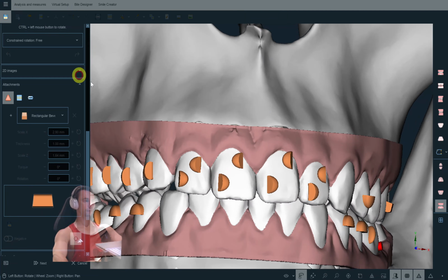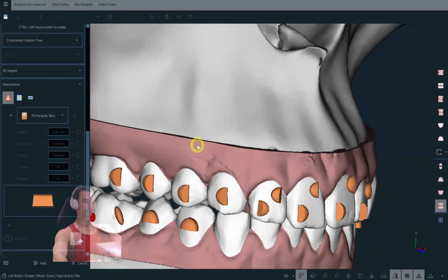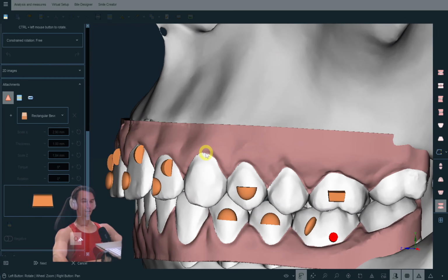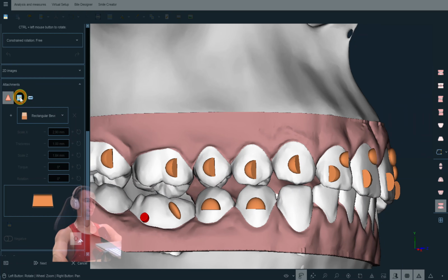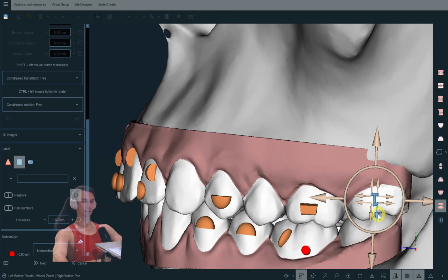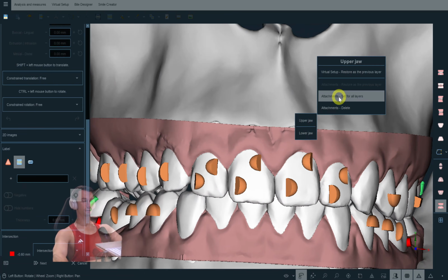And yeah, I save the progress from time to time because software can crash. Sometimes it happens, but really rarely, but it does happen. And we don't want to lose the progress. Yeah, we should not forget about numbering. That's it. And let's set it for all the layers.